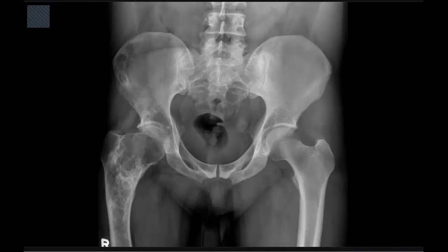I would like to check the other bones. There is no abnormality noted within the other bones. I will go back to this lesion. It's mainly on the right side. I'm checking now to see if there is any pathological fracture. I can't see any pathological fracture there, and no periosteal reaction. There is mild joint effusion noted within the right hip joint. And I can't appreciate cortical breach or cortical destruction.